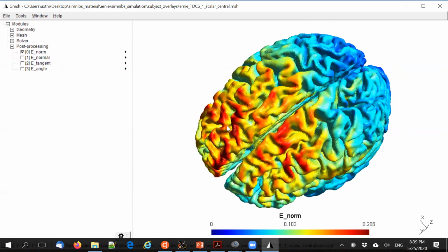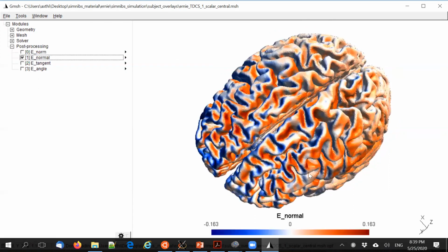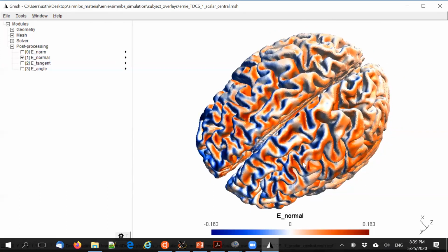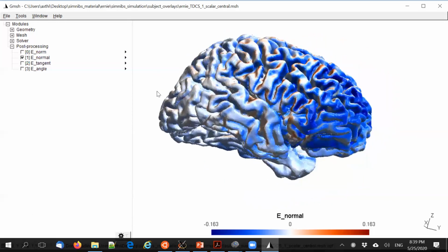Here, because now we have a surface available, which gives us a clear orientation, we can also look at the normal component of the field relative to the surface. So let's look at that. And then it looks a little bit different. Here now suddenly things become red and blue for inflow and outflow.